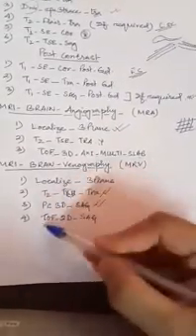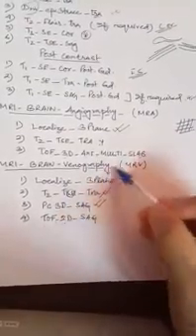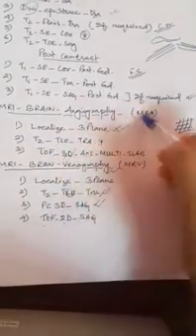Okay, after that TOF, again we are taking TOF, but it is in 2D mode. That is why it is venography. If it is in 3D mode, then it will be angiography.